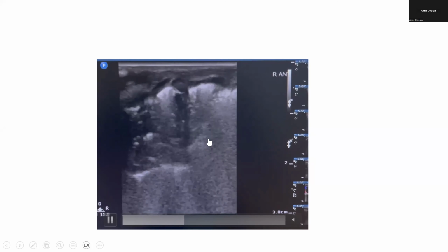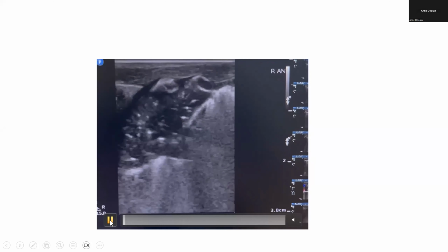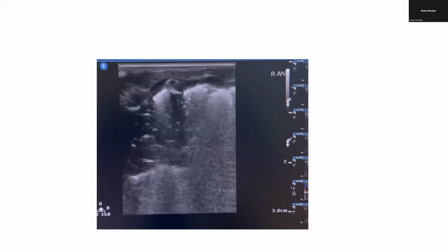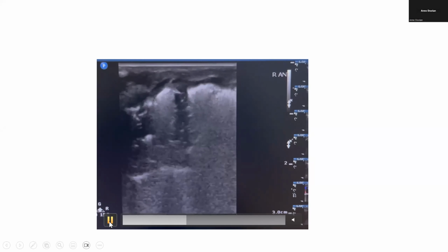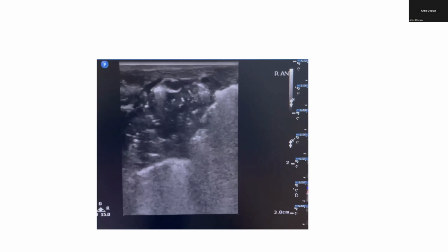When I saw there's bits where there's quite a sharp outline, I thought it's a pneumonia considering everything else that's going on. But again, I'm cautious and still learning. I thought the bronchograms looked static. I couldn't convince myself there was fluid moving in and out of them.